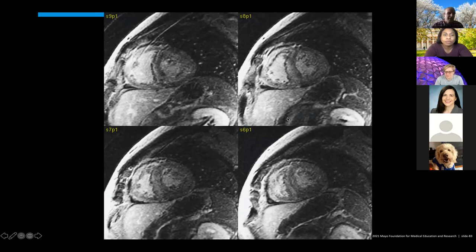The patient has what this patient has. We'll get to that in just a little bit. But first, describe the findings. What we see is, again, very granular, noisy looking myocardium. But if you look closely, there's sort of this diffuse enhancement all the way around, kind of from subendocardial to subepicardial. There's even some enhancement of the right ventricle. And so there's really, in my experience, just one thing that will do this, and that's cardiac amyloidosis.